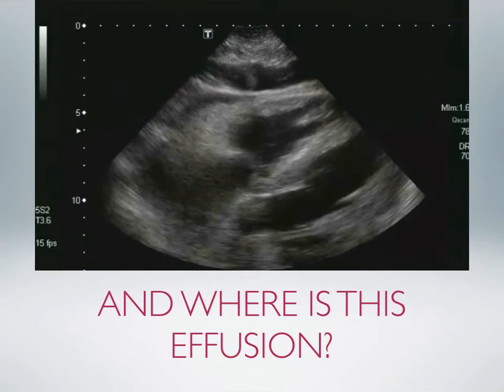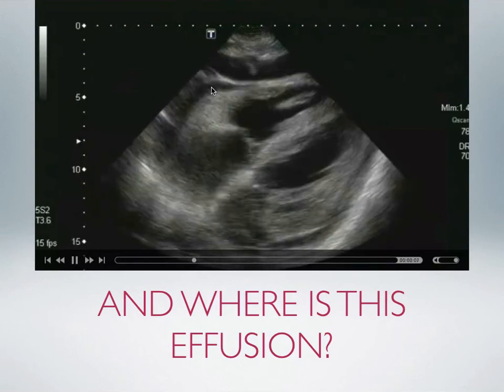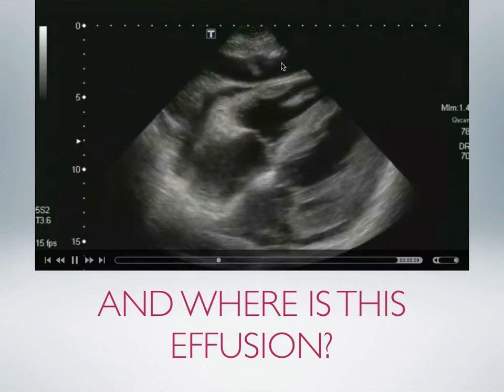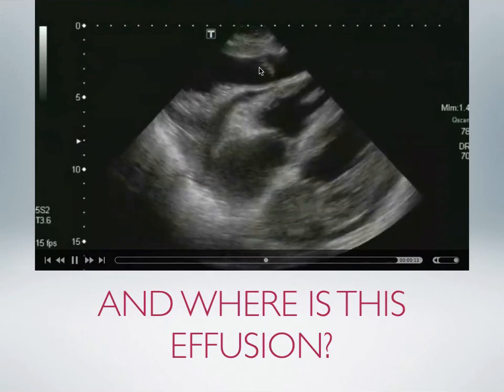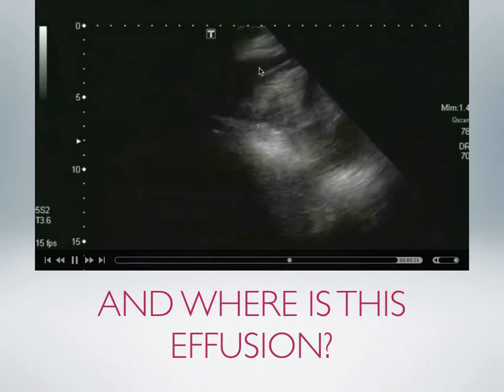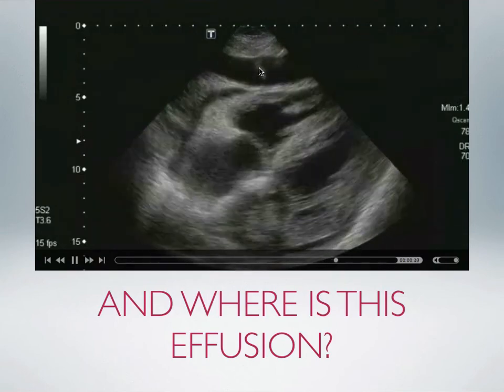This is another image with the same question. Where's the effusion? Small effusion up here. Liver. Ascites with a piece of omentum hanging down here. So two effusions: the ascites and the pericardial effusion in a subxiphoid view.